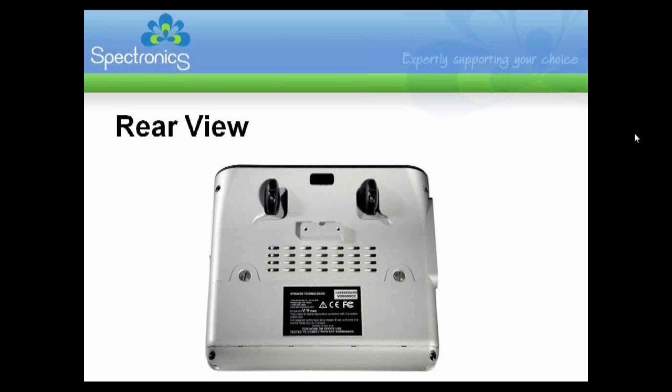This is the rear view of the device. At the top there's a little plastic area which is the other infrared port. There are also some attachments there for the stand, the 2 black attachments, and then a white raised part which is for a mounting plate if you were to put the device onto a wheelchair. And then you can see 2 screws which screw in the battery compartment. That's how you would access the battery compartment to take the battery out.